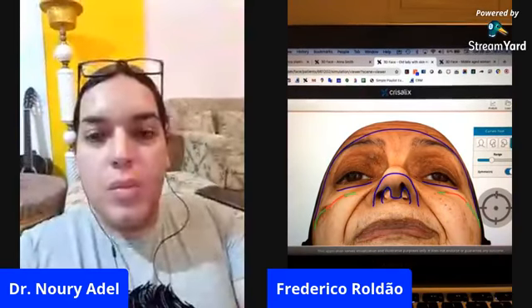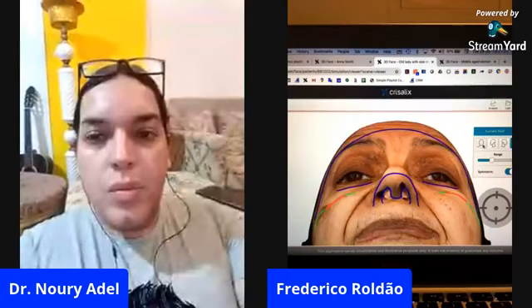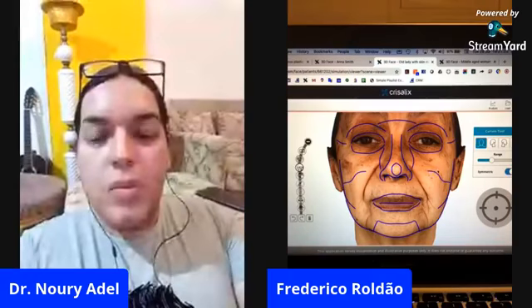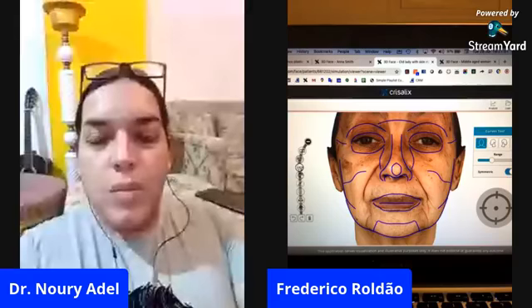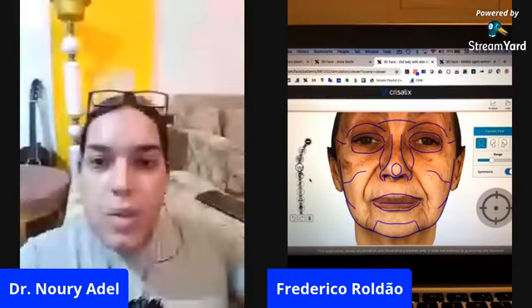I don't want to exaggerate. So let's take a look at her from the front. Okay, so we've stretched a bit. To give the final effect of the treatment, obviously we would have to simulate something on the skin. Do you agree? Yeah, exactly.